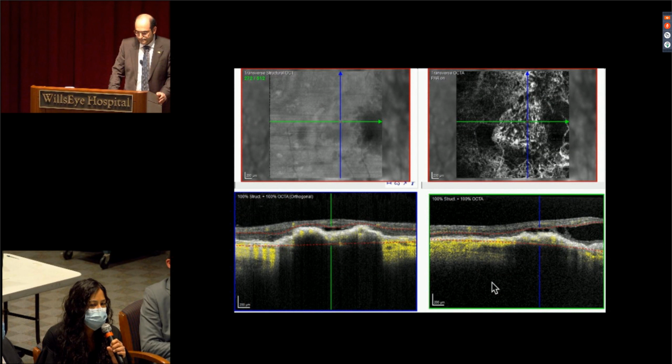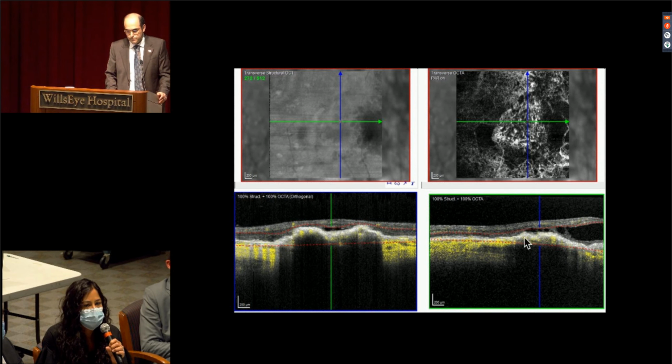I'll show an OCTA image of the disc. Yeah, so this is helpful. Obviously, you have to be really careful with the segmentation. But it looks like there's possibly, so this is going right through that area that was pretty suspicious, showing some hyperfluorescent signal. This does look like possibly there's some flow signal going through that area that looked like a fibrovascular complex.